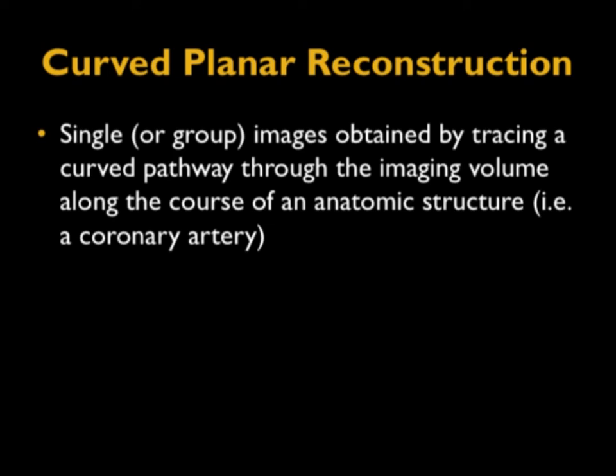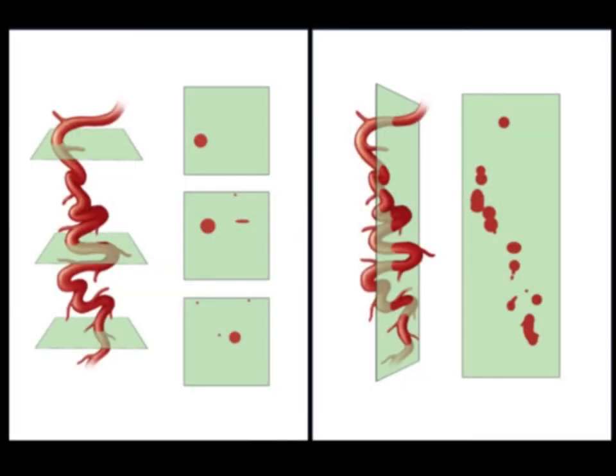It's kind of in between the routine multiplanar and the 3D imaging. Curved planar reconstruction is particularly good at tracing vessels that are running in and out of plane, that have lots of calcification. Because when you look at a curved vessel, whether from a coronal or a sagittal perspective, the picture is different because you have a lot of calcification, there's dropout of data. It's very hard to track.